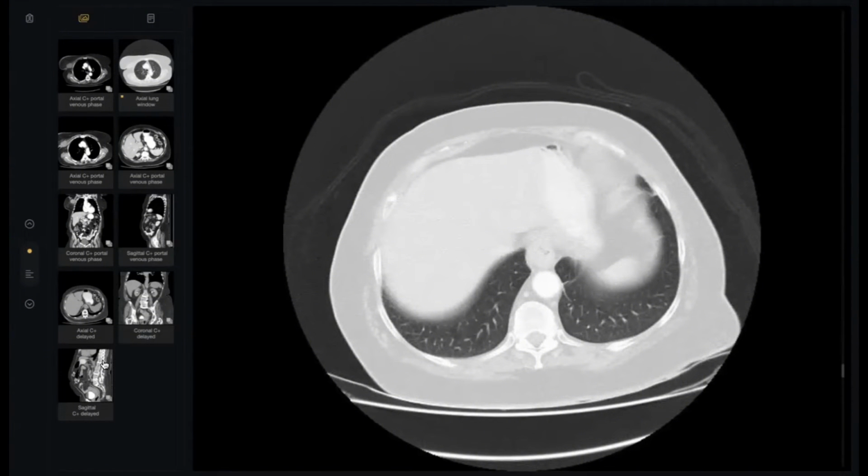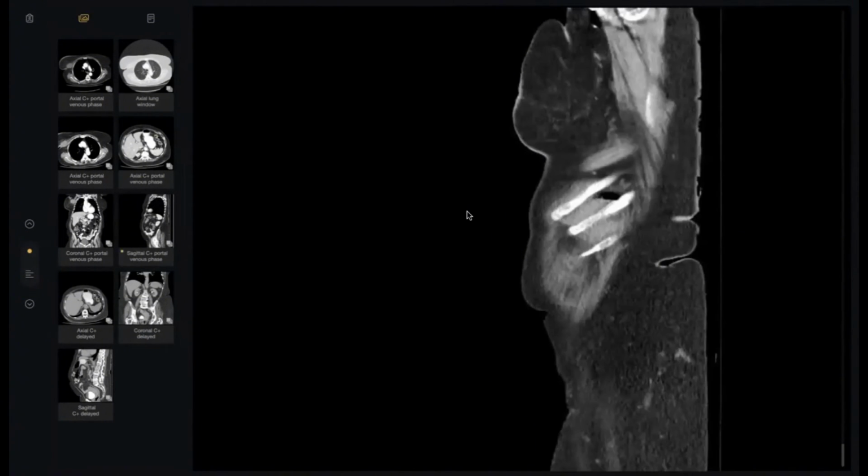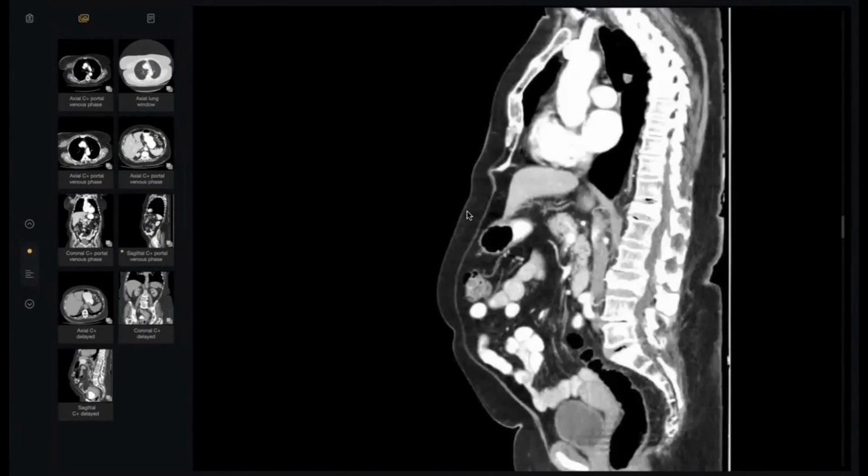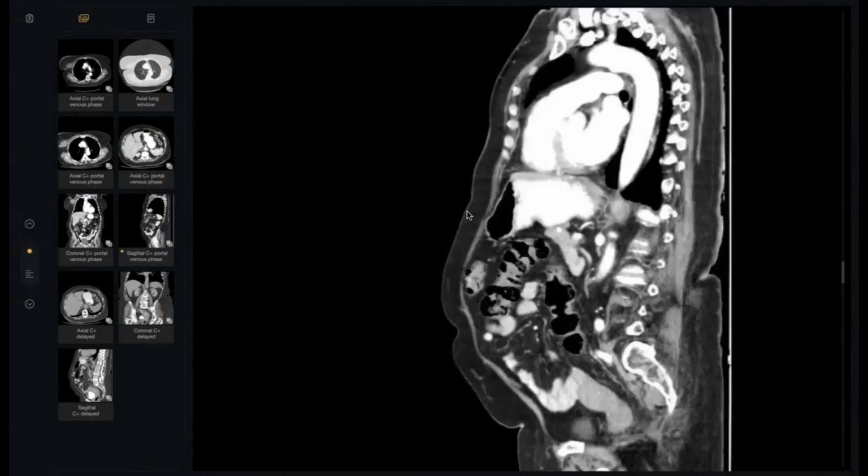No, tell me first. Which one and why? Okay, the last window, you mean the last sequence, the sagittal abdomen pelvis? Okay. Sagittal, to rule out. Why do you want sagittal? Okay, I would like to check for osseous lesions on the sagittal.